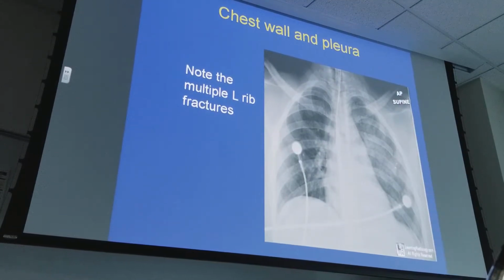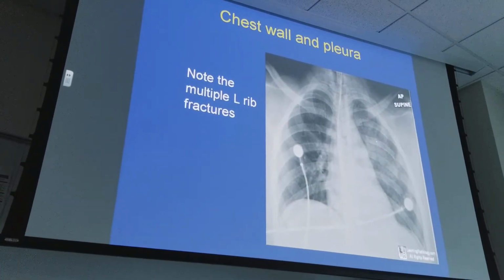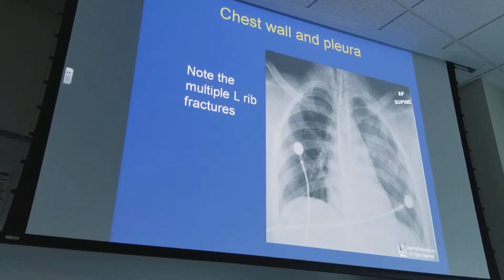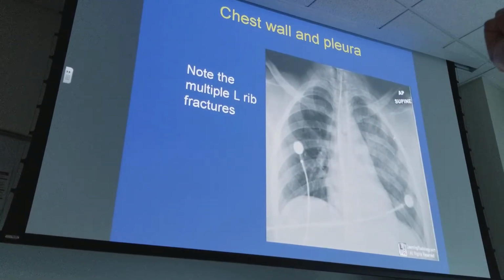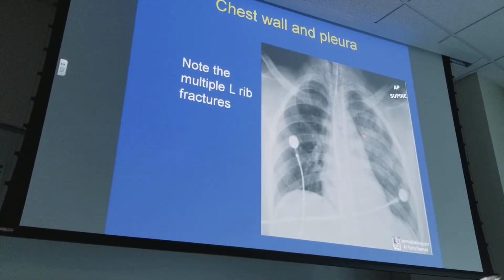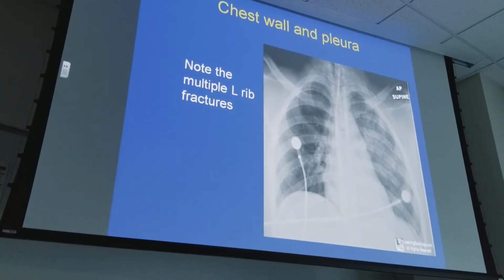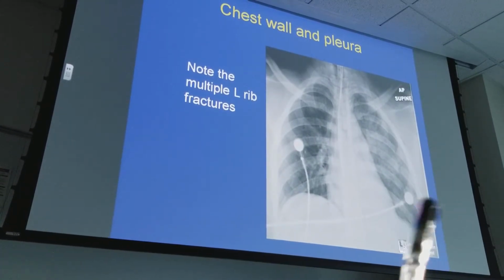So I only see 1 fracture here. So there's not 2 in the same rib. So this would not be a flail. Okay. Oh, that's not a fracture up there. The fourth one's a fracture. Is that the same rib? If you follow it right there. That looks like there could be something right there, but there's not 2 in this one. You have to have 2 parallel. So I don't see a flail here, but it looks like it hurts pretty bad, right?